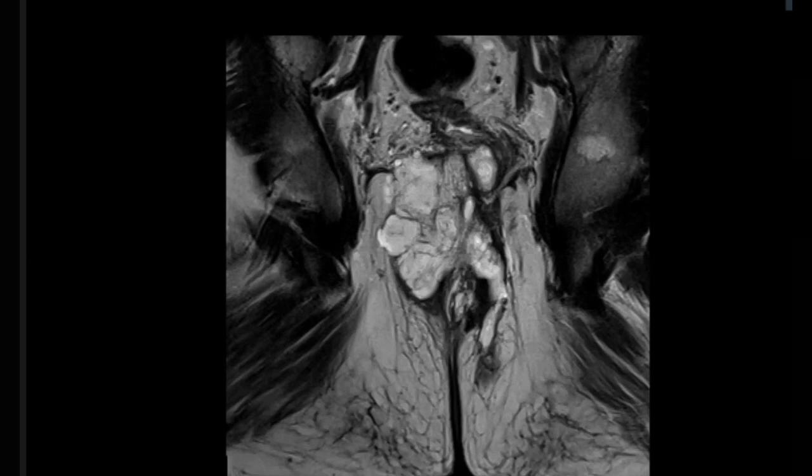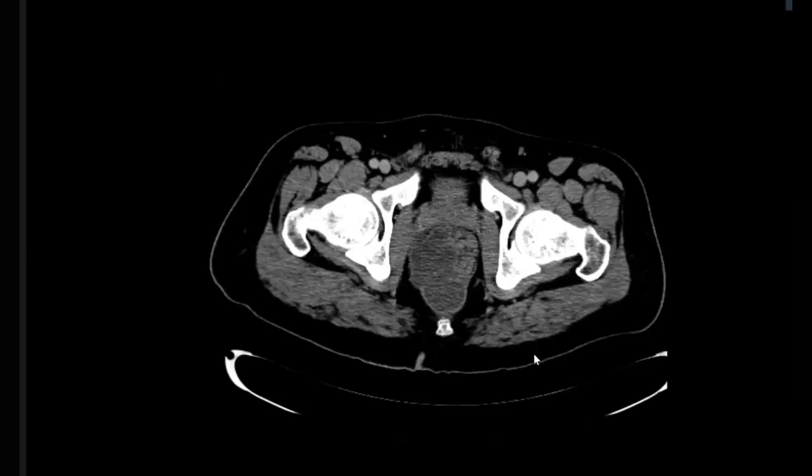So let's start from the CT again, please. This is a presacral or pararectal cystic lesion. The differential will include abscess, hematoma, malformation, teratoma, dermoid, rectal duplication cyst, and I will consider in this patient also mucinous adenocarcinoma, which can present as collections. So my next step, I will do a local MRI for characterization of these lesions.